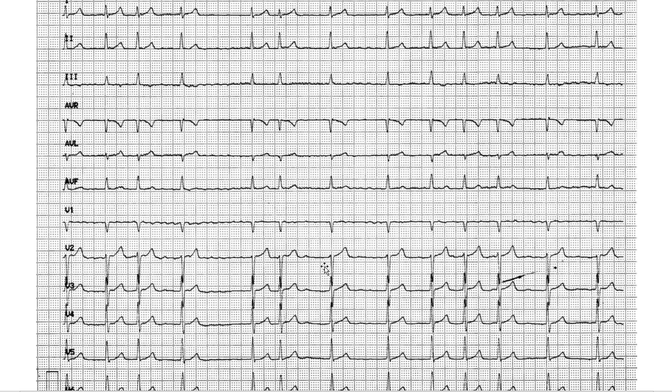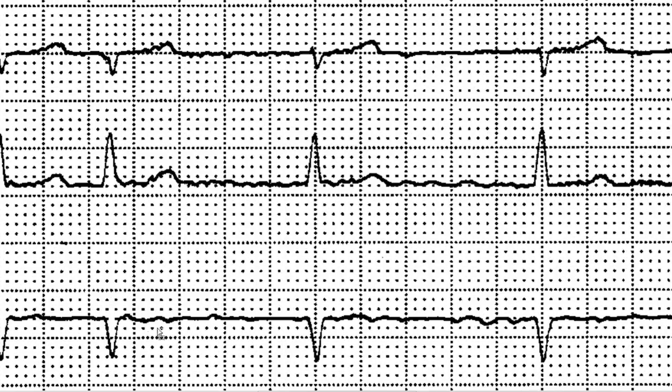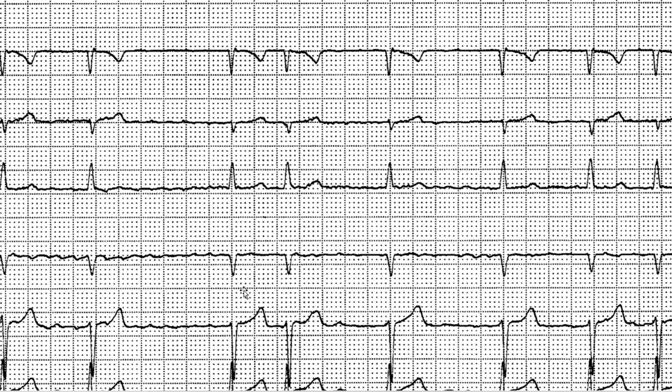Now let's check the next ones. Keep going. So here, there we go. This is a QS, okay? This is what you call a QS. In AVL it is debatable. You can debate that maybe it is also QS, so I can't really say for sure, but here it is quite clear, especially right here. There is no R, so it is clearly QS, and it's quite big, 1, 2, so that's like 0.6 or 0.8. So that's clearly pathological, yeah? We mark that, and that is the main thing I wanted to show in this example, okay? And we can move on then.